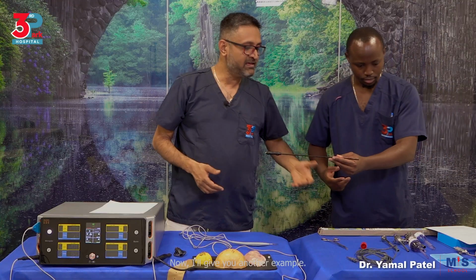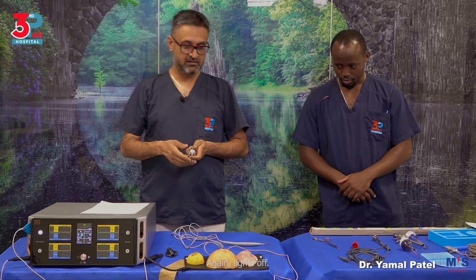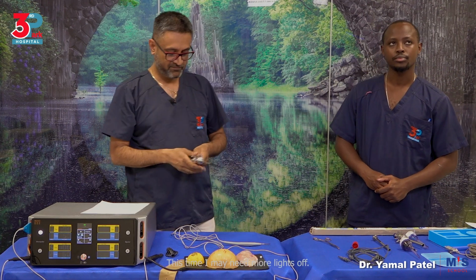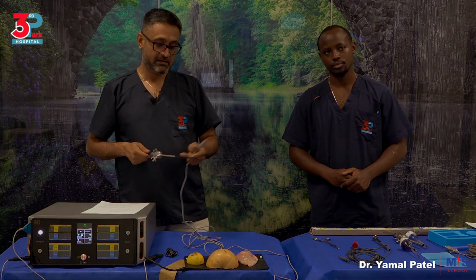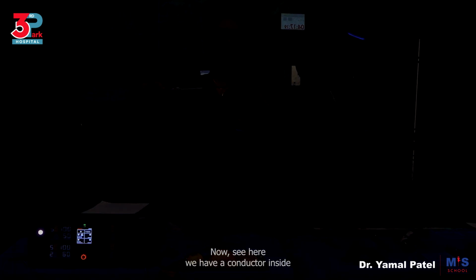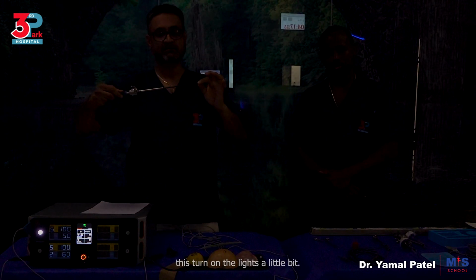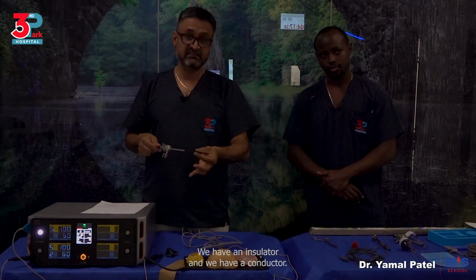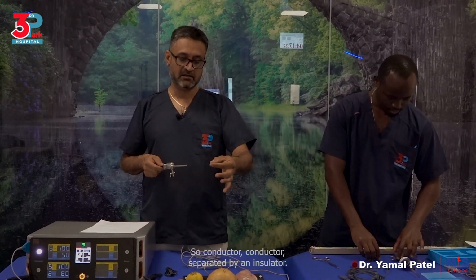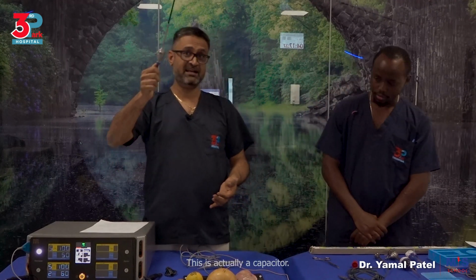Now, I'll give you another example. Again, lights off. This time I may need more lights off. So I want us to see something very closely here. Now, see here, we have a conductor inside. Just turn on the lights a little bit. We have the metal conductor inside. We have an insulator, and we have a conductor. So conductor separated by an insulator. This is actually a capacitor.